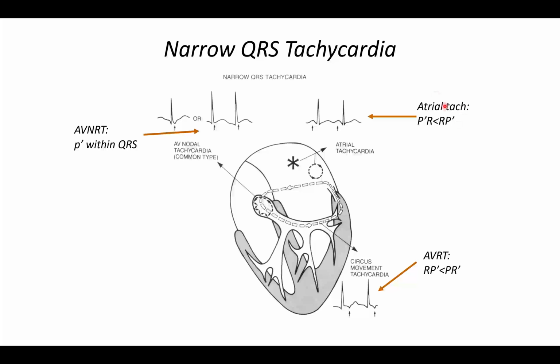The third common tachycardia is atrial tachycardia. So there is a single focus and it is firing. Whether it's a focal mechanism, triggered activity, micro re-entry, or for that matter atrial flutter or atrial fibrillation, it will keep firing. It will not bother whether these beats are going through the AV node to the ventricle. So even in atrial tachycardia, the His and V are not an essential part of the circuit.